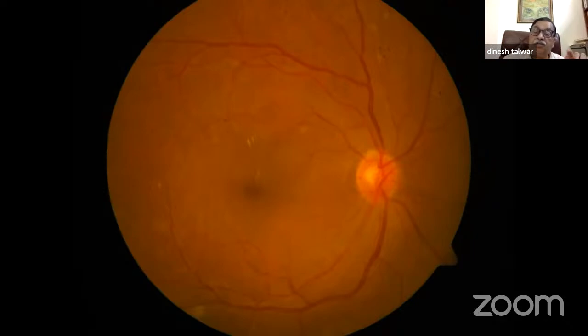The grayness of diabetic macular edema makes the capillary network less visible. Normally, what you're seeing is a net, the capillary net of the retina, and you're seeing the choroid through that. So you're able to see the elements of the net, and then you see the choroid behind that, the reflex from there. In an area which has an edema, the net is not seen. That is why it's gray. That is why it's not out of focus. It's within focus in that sense, but it's a little grayish looking, and the capillary network is less clearly seen. That gives you the idea that you're dealing with macular edema.